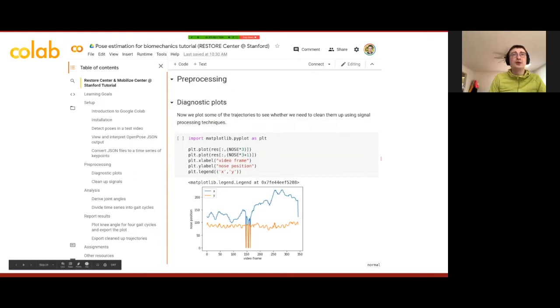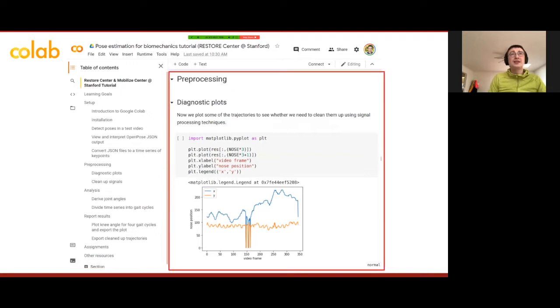So the main view of the Colab, when we look at the code window, you can see that we have some text at the top with some nice headers that I prepared for you. We have some code blocks here that we run scripts within, and then we get the output of those scripts. That's the main part that you will be interacting with, the main window.